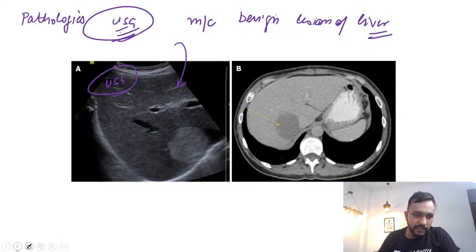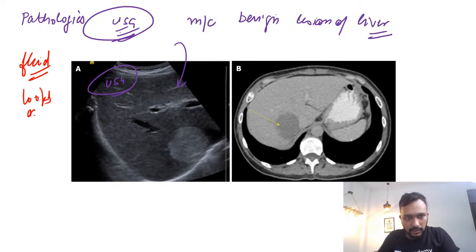So just remember that on ultrasound, your fluid looks black, or anechoic. Okay.